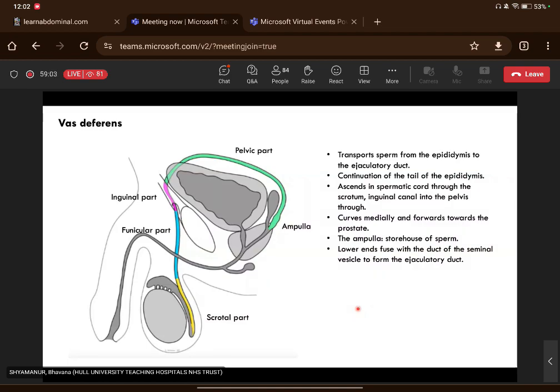And of course, if you come a bit higher at the level of the bladder base, you start to see the seminal vesicle, so that helps as well. If you are much lower, more distally, and it is tricky, also look for other things around that can help, like the soft tissues. Can you make out the labia majora in women? And if it's a male CT, can you see part of the penis coming in? So I think it can be tricky, but try to look for anything that you can find to help you.